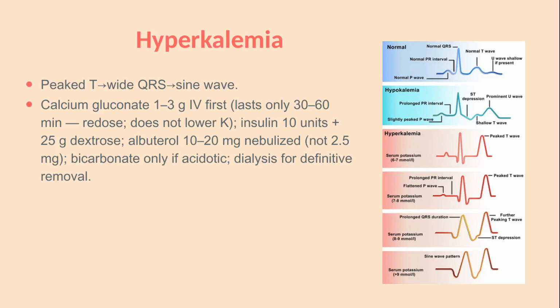before disposition. Hyperkalemia is the dysrhythmia mimic that kills while the sample writes to the lab, and its ECG progression should live in your memory. Peak T waves first, then PR prolongation, then QRS widening, and finally the sine wave that immediately precedes arrest. A wide, slow, bizarre rhythm in a dialysis patient is hyperkalemia until proven otherwise, and you treat the tracing, not the pending result. Calcium comes first, stabilizing the myocardium within minutes without moving the potassium.